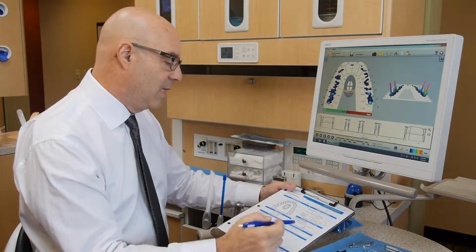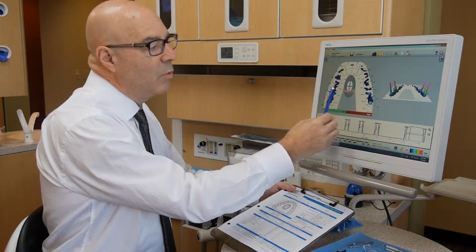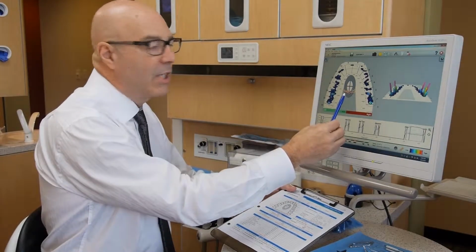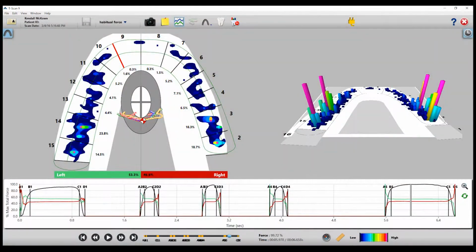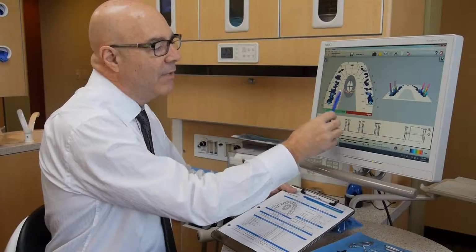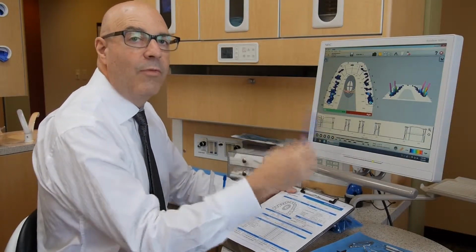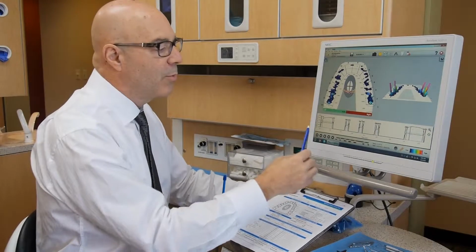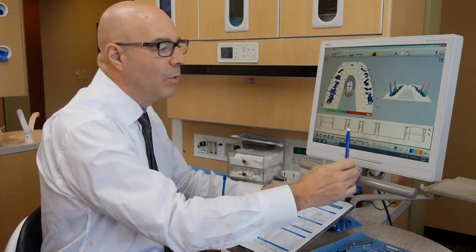The first section on the force distribution form is we want to look at the kite tails, which are officially called the center of force trajectory on the scan itself. We usually put our time cursor into the last squeeze or the last close, harden hold at about maximum force. And then that will give us a pattern of center of force trajectories that will represent the patient's normal force pattern as they go through their close, harden hold, their 3 chomps, and their final close, harden hold.